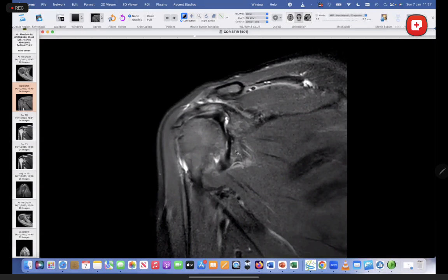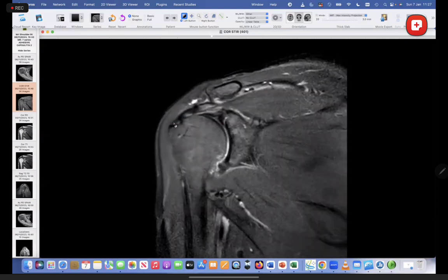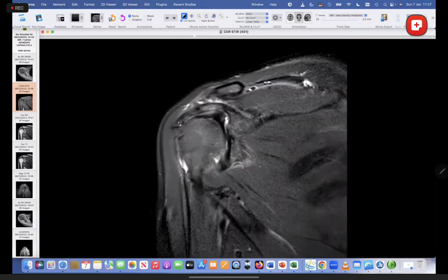So what we then do, we use this sequence primarily for the rotator cuff tendons. In other words, the supraspinatus tendon, which is the main tendon which gets affected. If you look at the supraspinatus fossa, you'll see the big muscle belly with the tendon coming in, and it inserts all the way to the tuberosity. Now, you must always look at this. This tendon is about 2.5 centimeters front to back. So that's quite a big tendon. It's like a big band which comes across.